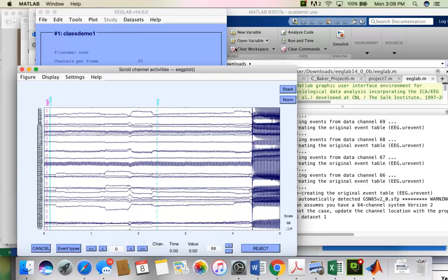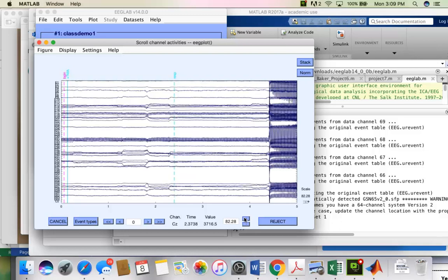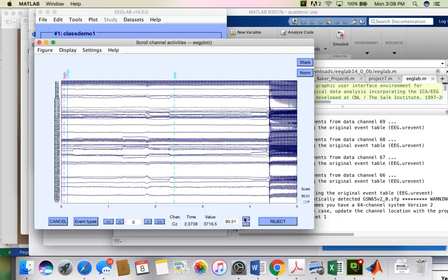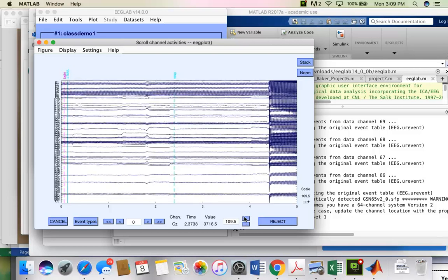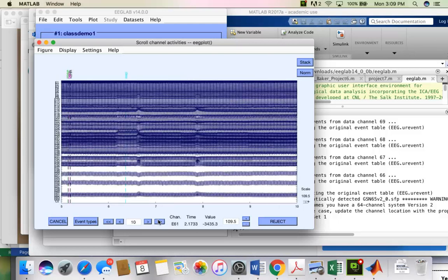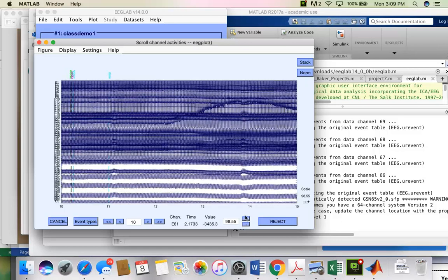You can see that it kind of looks like a mess. We're clearly picking up some kind of noise, probably 60 hertz. We've got a lot of odd spacing between the channels. This is like an oscilloscope adjustment: it adjusts the vertical sensitivity of the channels. And this steps through time in seconds.